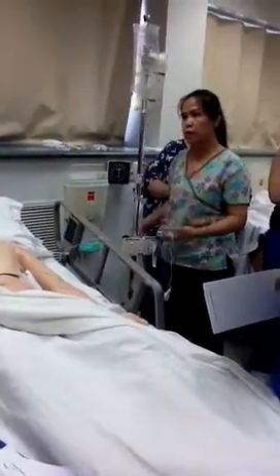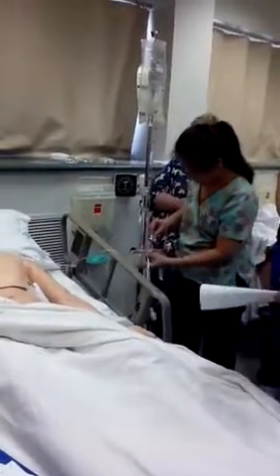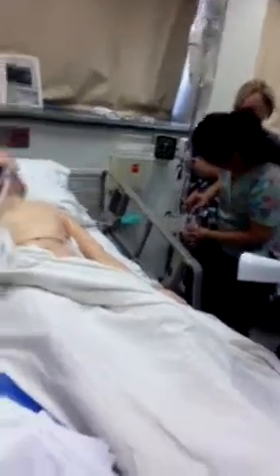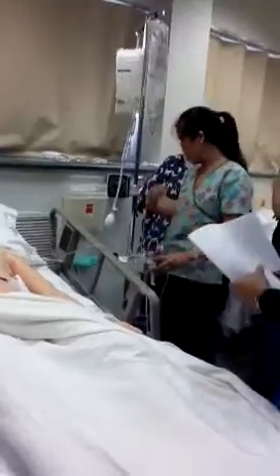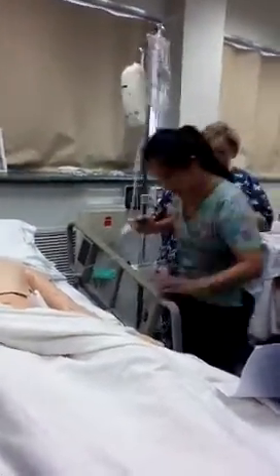Even though you have different kinds of outdated equipment, always trace it to the patient and see which one is the tube. Any question on that one?